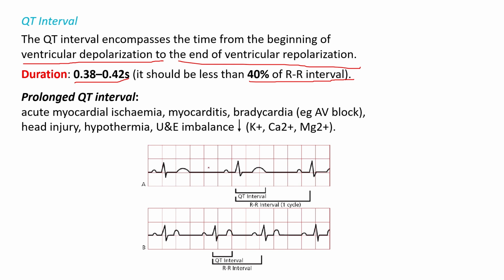In another word, for example, which one should we take? Let's take this one. Let's say it starts from here for the sake of the argument. 1, 2, 3, 4, 5. Well, it will be around 2.5. The middle will be here between these two RR intervals. Okay, let's say this is the middle. The T wave ended before the middle of the 2 RR intervals. That's why the QT interval is normal. So this is how you can apply it.